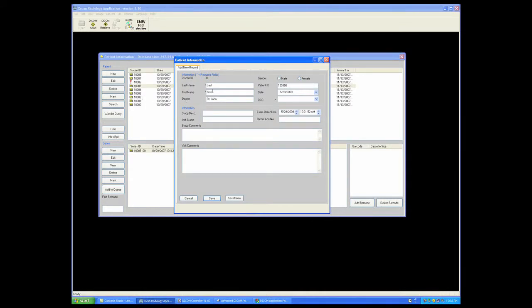However, if you do not assign a patient identification number, the iCRco software will assign one for you that is a combination of the patient's last name and sequential numbers. Gender is optional. Birth date is mandatory. The date field will always launch with today's date, but that can be changed to the birth date by simply arrowing left and right through the numbers and changing the data displayed.